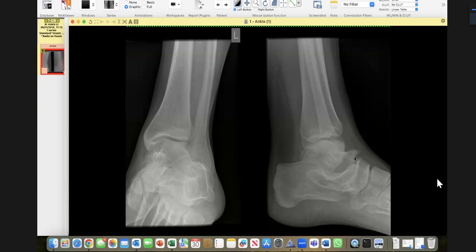Yes, so there is a fusion of the talus and the calcaneum, and I'm also suspecting involvement of the navicular bone as well, but I can see that the navicular bone cortex appears to be intact, and there is a space between them. So this is likely a case of talocalcaneal coalition. Sir, I will inform the finding to the referring physician and would advise CT for further characterization.